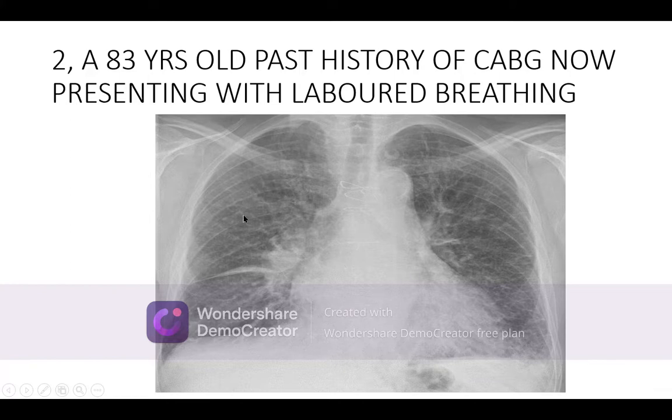And the whole of the chest wall, now these bronchovascular markings are touching the lateral wall. It means the congestive changes are seen. The angle of the left side is obliterated here. It should be very clear. It is flat. The cardiophrenic angle is normal. Here the costophrenic angle is normal, flat, and the cardiophrenic angle is normal.